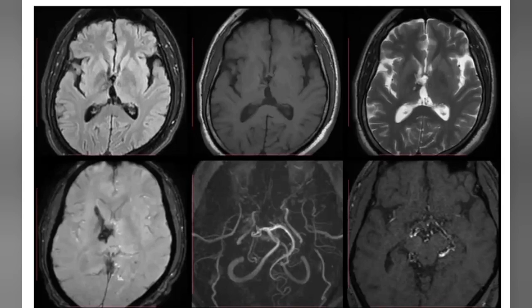In contrast study, they are showing no contrast or minimal contrast. So which one do you think is the most contrast image? 1, 2, 3, 4, 5, 6. Which one? Fourth. This is basically SWI image, also called SWAN in GE. So this is SWI. Okay. Now what's your interpretation?